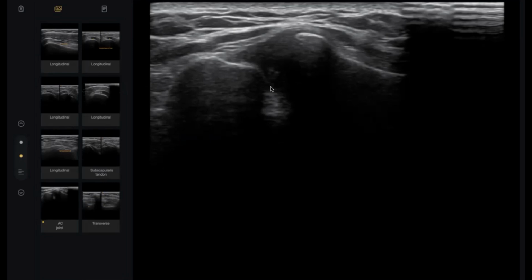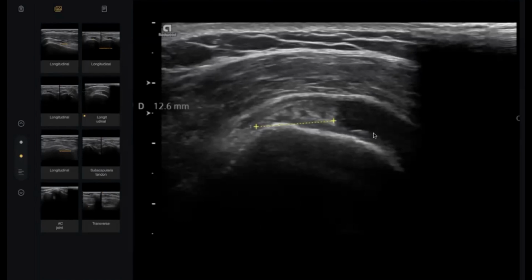Why? Type 3 and 4, because one of them has a hook and one of them has a convex border. So this hook or convexity exerts a friction, meaning tearing power, on the supraspinatus. So type 3 and 4. Also low-lying acromion or os acromiale.